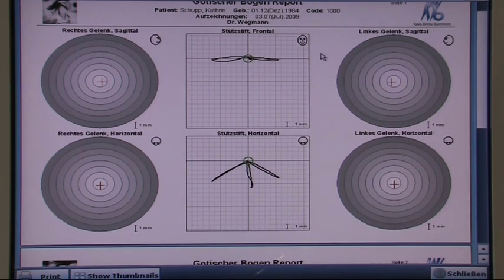Hereby the end position, which I captured with my registration and previously determined as the desired centric position as a green circle, is displayed in the form of red crosses.